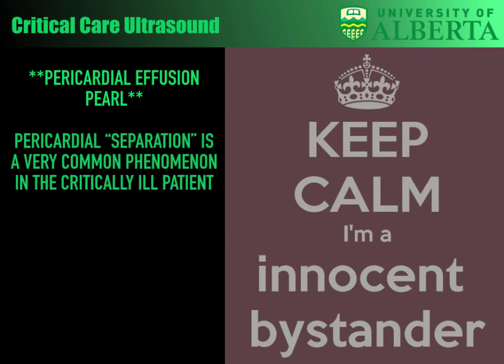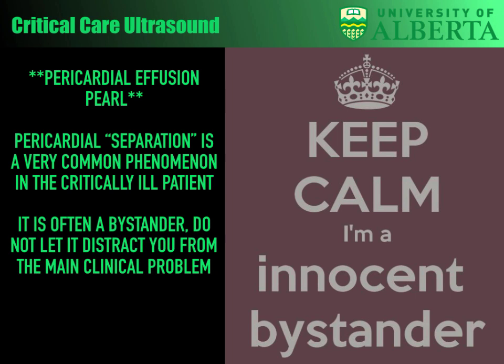I think one of the most important things to realize is that pericardial separation is a very common phenomenon, and calling everything an effusion may be wrong because it may be just separation. There are lots of reasons, like fat, that can lead to the appearance of effusion. It is often a bystander, so don't let it distract you from the main clinical problem. We will go through how an effusion becomes a hemodynamic problem shortly, but keep in mind that you will often see a lot of them, and they may have very little impact on the patient's clinical picture.